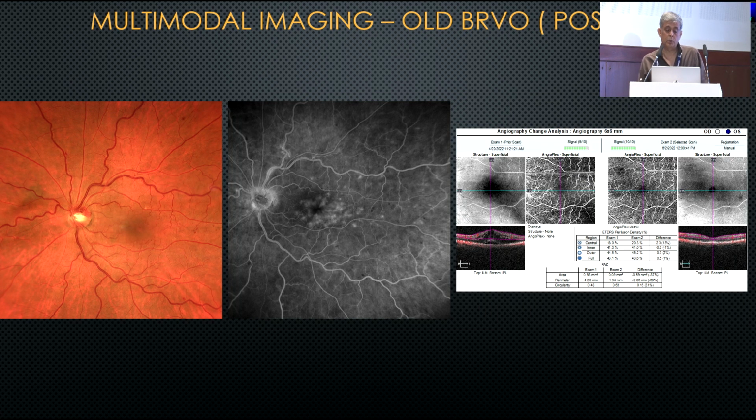This is an old patient with BRVO. She's had BRVO for a long time. We've given her multiple injections, and the follow-up is usually done for her by OCT alone, which is showing an improvement in the slide on the right.